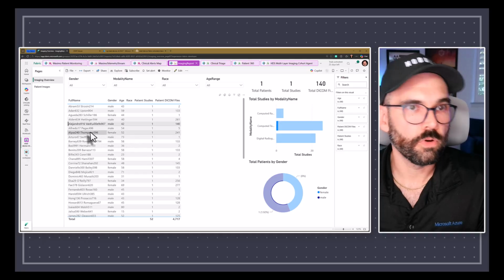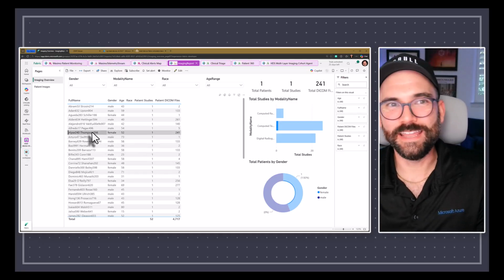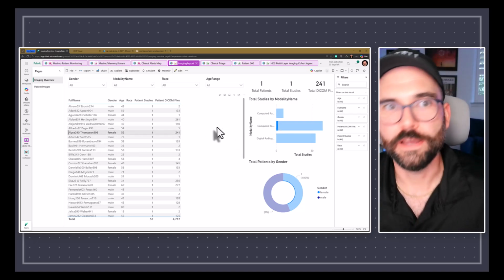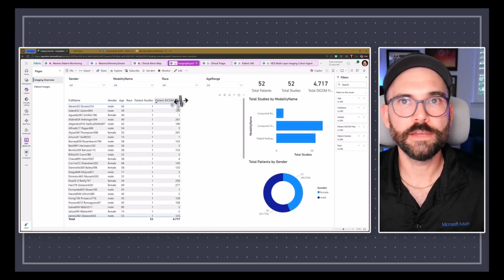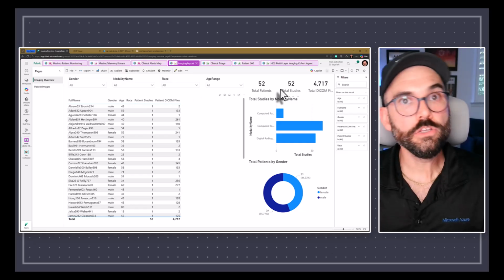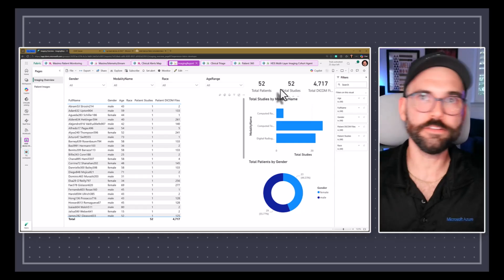And then for Lisa Thompson, these are all fake, by the way, fake names. That's why they have these numbers behind them. I can see she also has some CTs as well. I can do some modalities and try to find male, female, and kind of make a cohort by myself. Or I can use the last bit that is deployed as part of this entire thing.